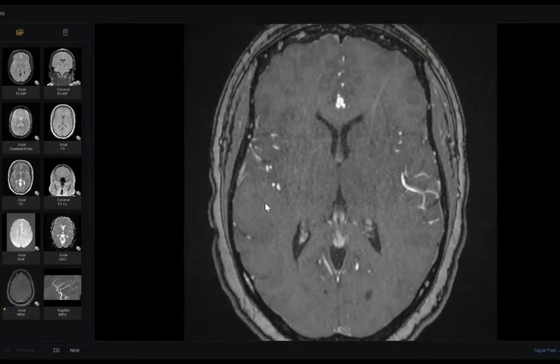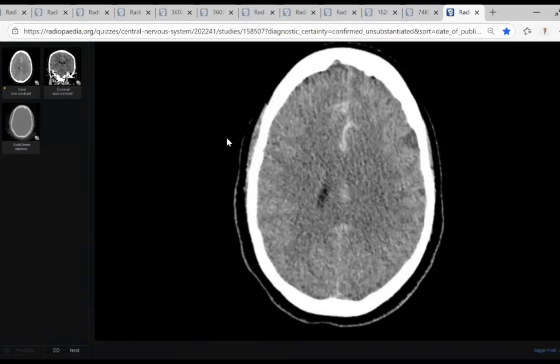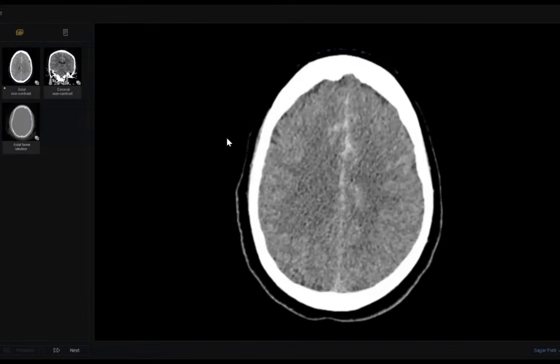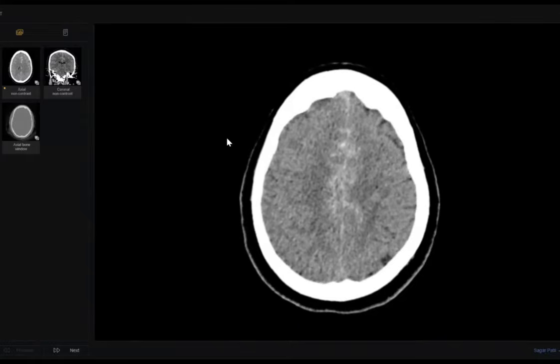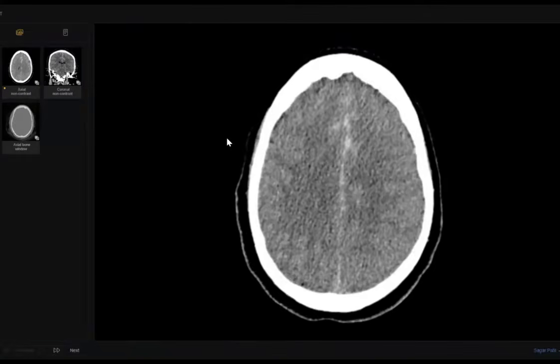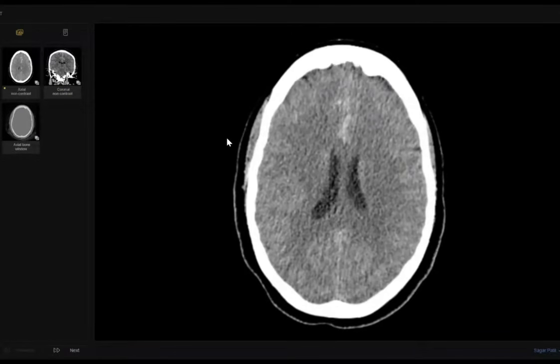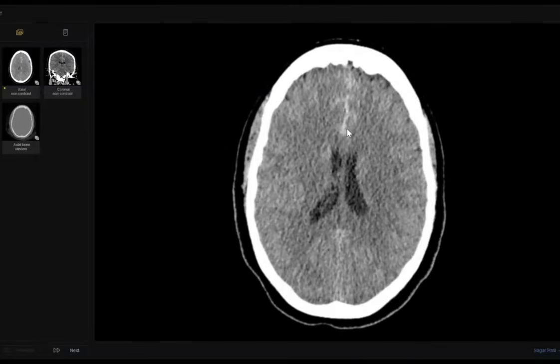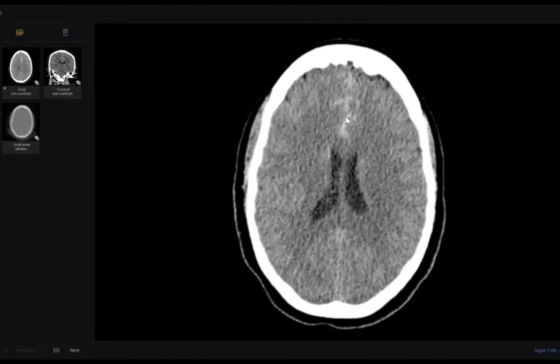It was a case of subarachnoid hemorrhage, as you see here. If we revise the CT again, what happened here? There is a considerable amount of interhemispheric hyperdense material smearing the sulci and extending in the interhemispheric fissures. Here, especially anterior, is the most sizable. So this is the site of rupture. Where is the site of rupture? The site of the largest hematoma, I think here.